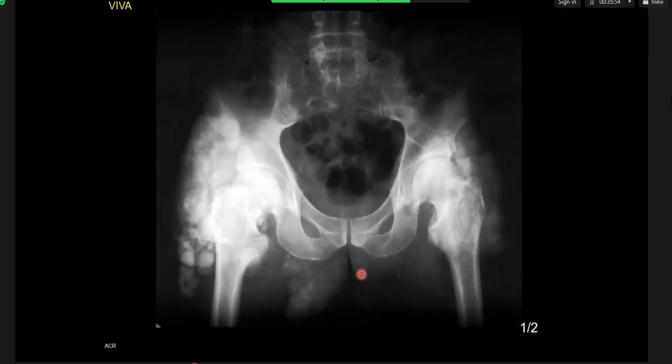So this is an X-ray of the pelvis with the upper legs showing extensive exuberant calcifications of the soft tissues bilaterally around the hip joint, and further just below the right pubic bone as well. Underlying bones seem normal. My differential diagnosis for these exuberant bilateral calcifications would include scleroderma. I would also include hyperparathyroidism. Tumoral calcinosis is less likely because it's bilateral and symmetrical. Myositis ossificans, but that most of the time is not bilaterally symmetrical.